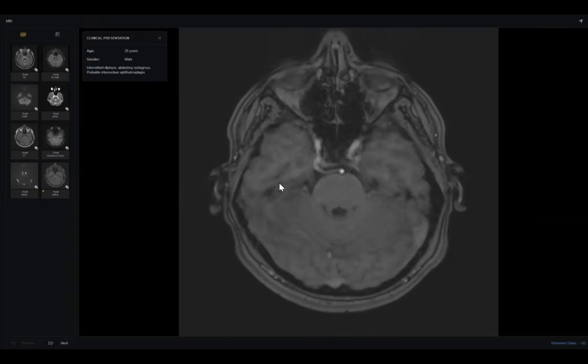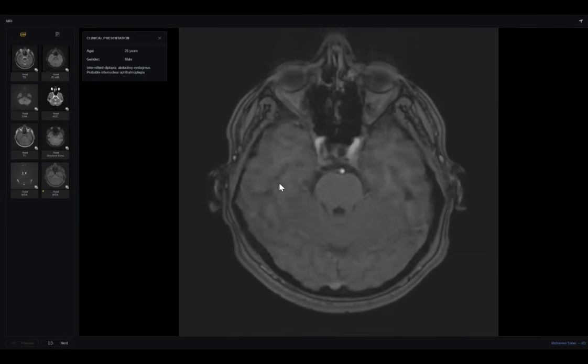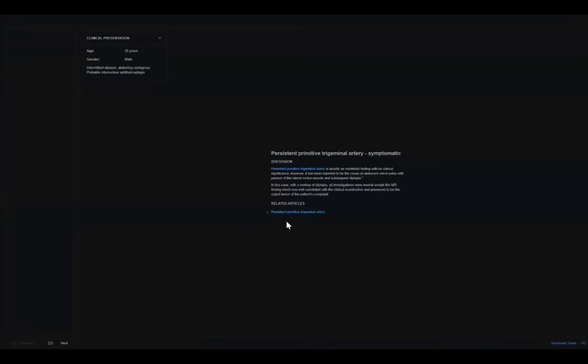Last question: the most common sign of the primitive trigeminal artery? The tau sign. Excellent, but it is better seen in sagittal. Tau sign, I think it is a Japanese or Chinese letter or figure. Thank you, doctor, so much. I will show you, my colleague, what the tau sign is, but it is better to leave the mouse.